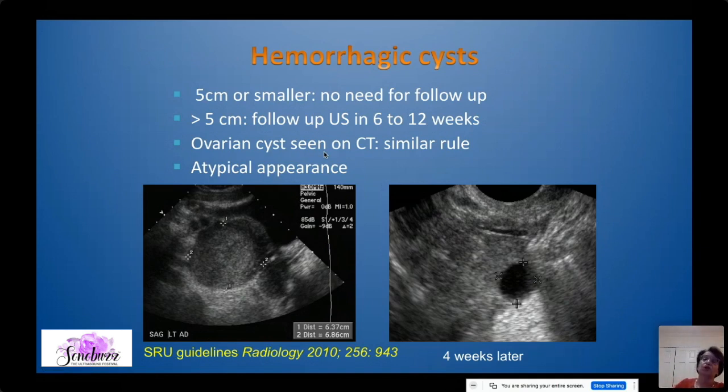You basically apply the same rule. You don't really need to get an ultrasound to follow up. If they have an atypical appearance, such as this one, which looks more solid, then of course you'll get a follow-up. And you can see that this patient came a little bit earlier than we suggested, but anyway, it had already resolved, or at least gone significantly smaller.